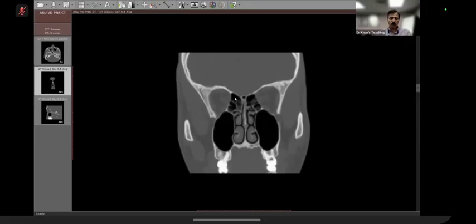Finally, all paranasal sinuses CT, please remember, are basically in bone window, right? So you have to ask your radiographers to send a normal soft tissue window also on PACS, and you have to evaluate that also. Otherwise, you are going to miss things.